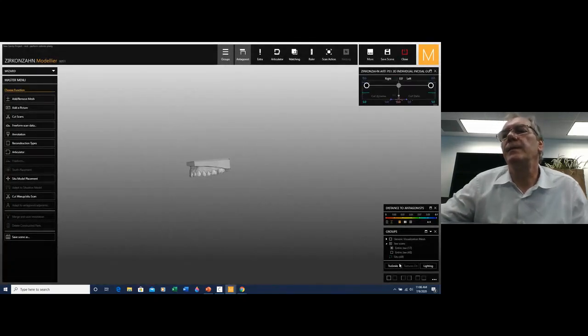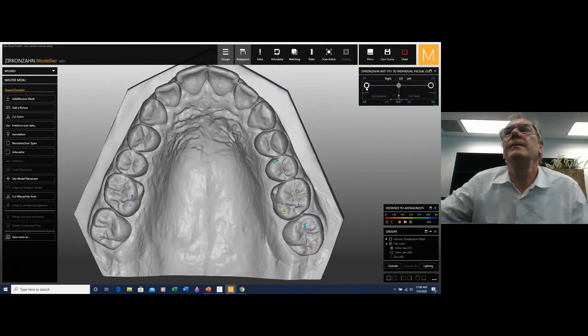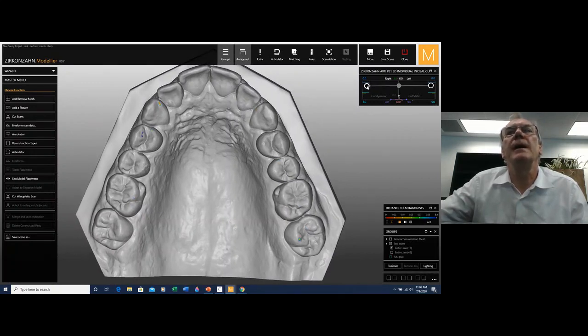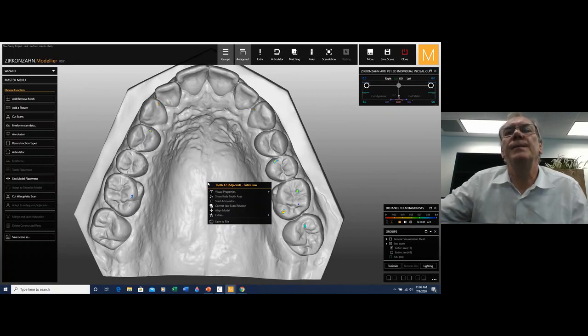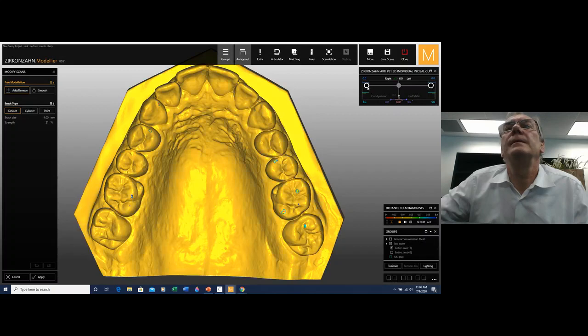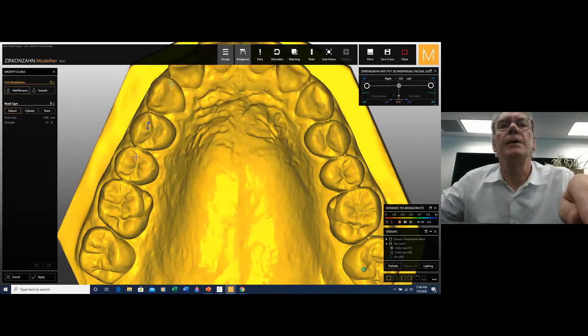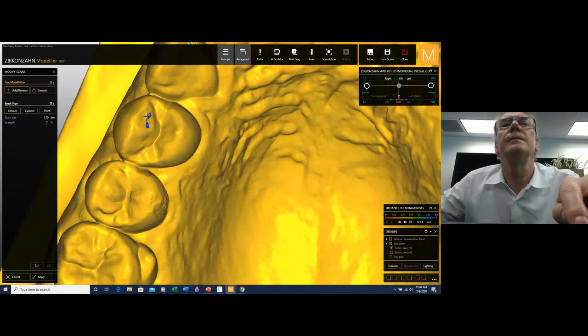Got it. Let's flip it over. And we go again. 1, gone. 2, 3, that's back. 4, 5, 6, okay. So that means that we need to eliminate just a little bit more material. 1, 2, and we go ahead and we perform exactly the same procedure. Okay, it's a little bit too strong. I'm bringing it down to 11. Don't want to put too much.